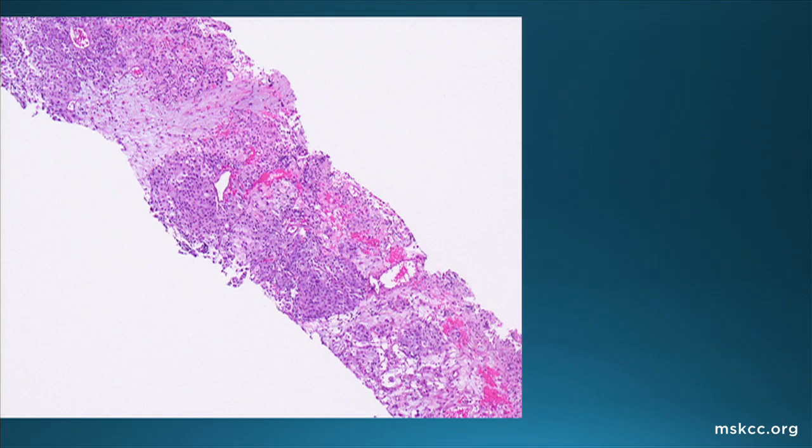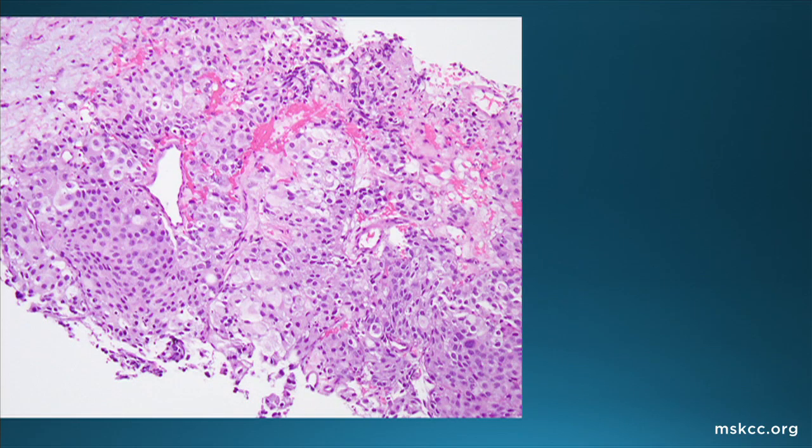This is a more unusual scenario which we are only first recognizing within this spectrum. This is from the liver of a patient who'd been treated with androgen deprivation therapy, hormonal therapy, and we saw sheets of cells. And at high power, you'll note that they have plenty of cytoplasm. This is not small cell carcinoma, doesn't really have features of large cell carcinoma. You can see some prominent nucleoli, and in the center, and I've highlighted it there, you can see that same bubbliness from hormonal therapy that we see, albeit not with the pycnotic nuclei.